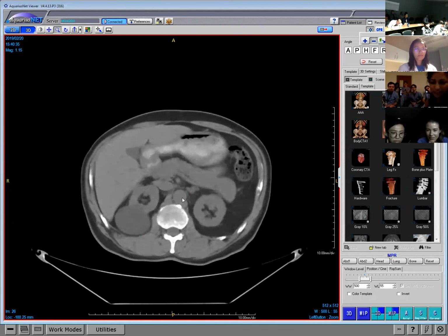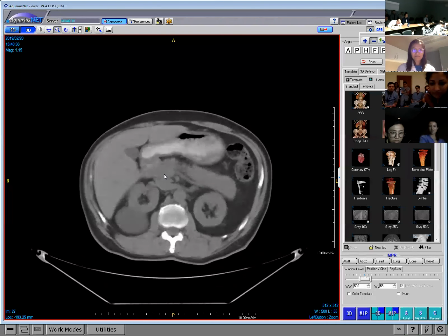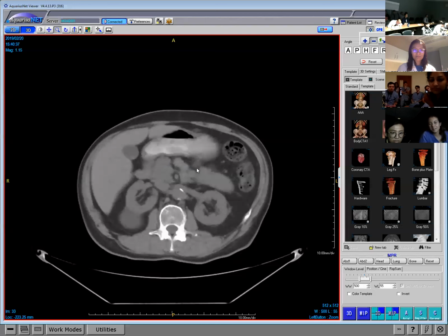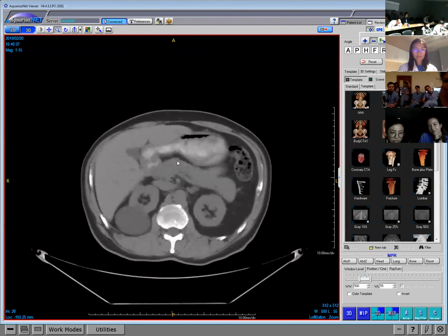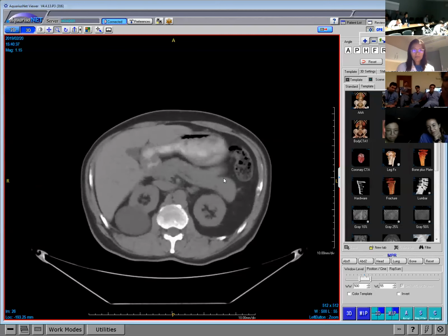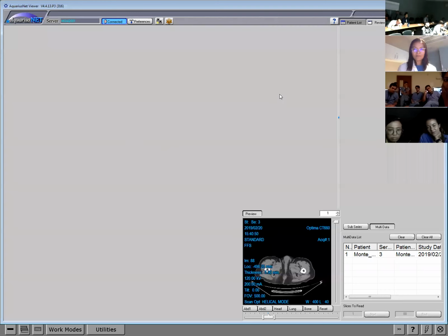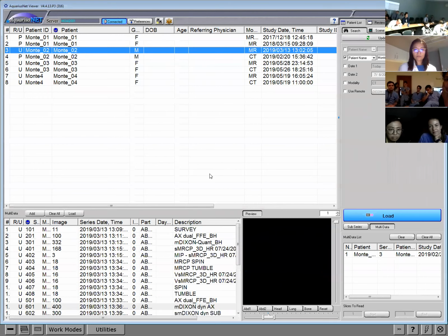Yeah, the pancreas looks a little sausagey, especially the tail. Right, so that was picked up. You can see that the tail has lost that nice feathery appearance, as you can see here. It's very subtle. So the patient had a follow-up MRI about two weeks after.